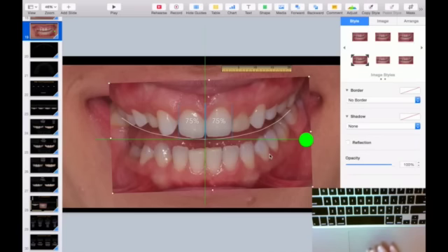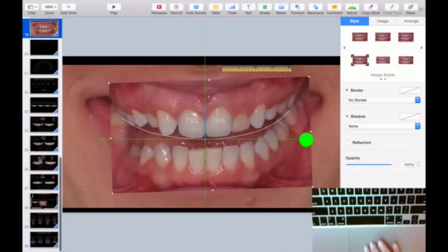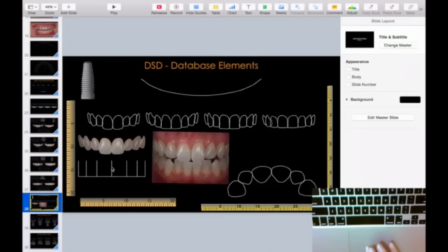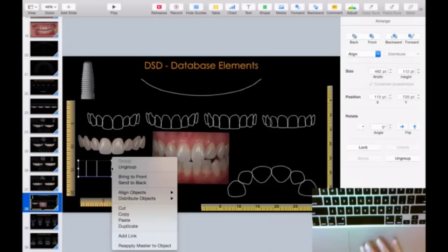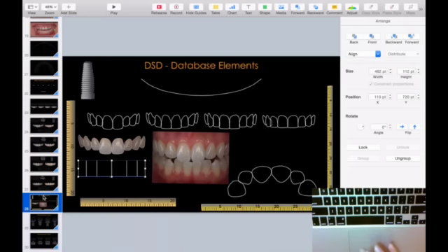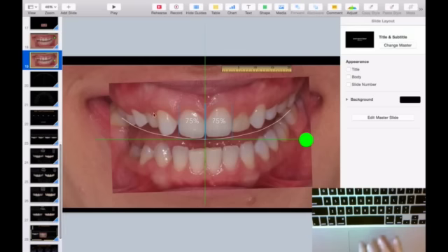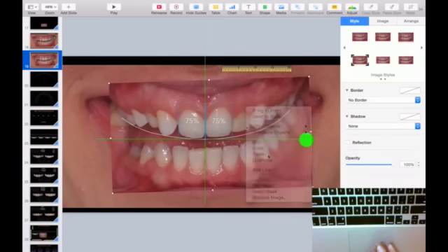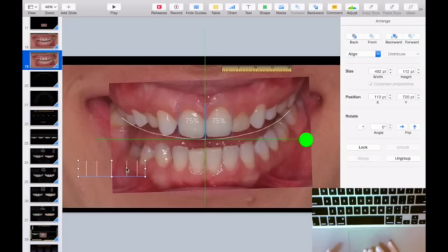Okay? Once I do this, I have to get my proportion ruler. This is already done with measurements of aesthetic dentistry. The proportions in a frontal view are what is most becoming to the eyes.